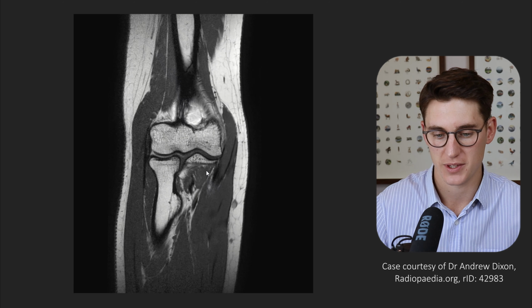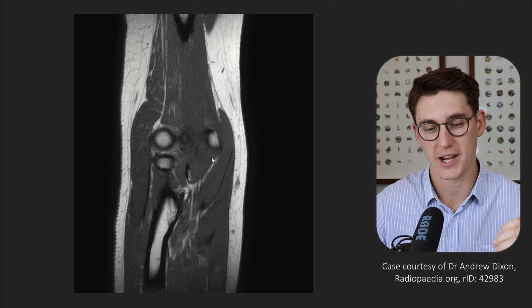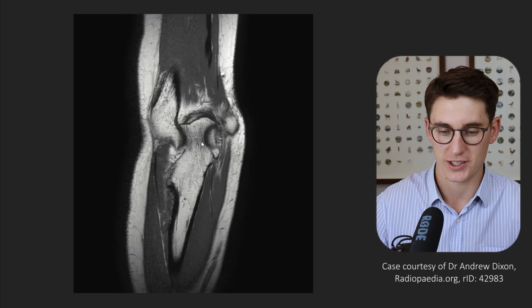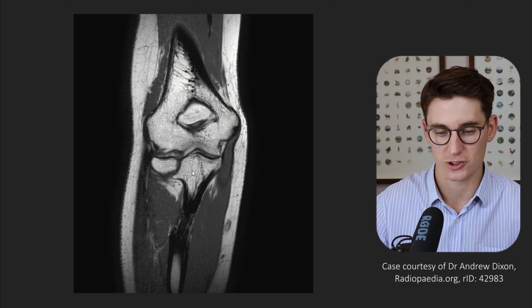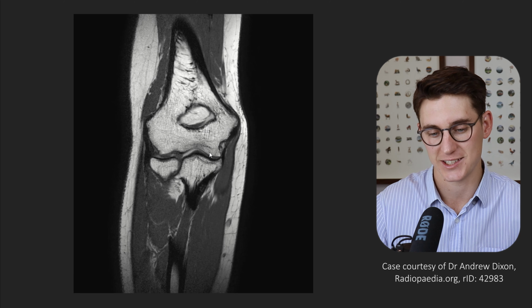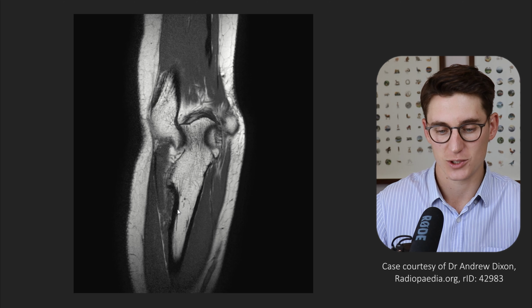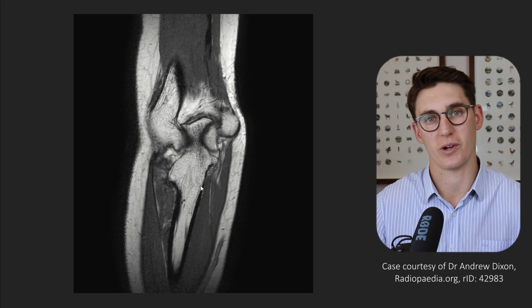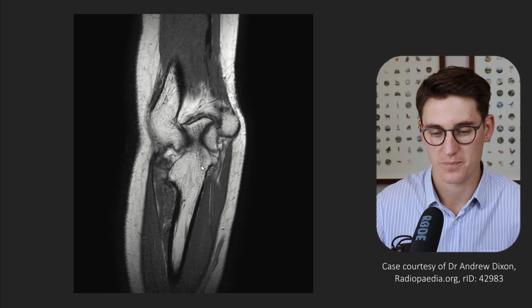Our ulnar bone can also be separated into multiple parts. If we go right posteriorly in the image here, we can see our olecranon posteriorly, our trochlear notch coming around to our coronoid process anteriorly here, and then the ulnar bone heading down towards the ulnar shaft, as well as having our ulnar tuberosity here where our brachialis tendon is going to insert, and we're going to have a look at that when we look at the tendons.